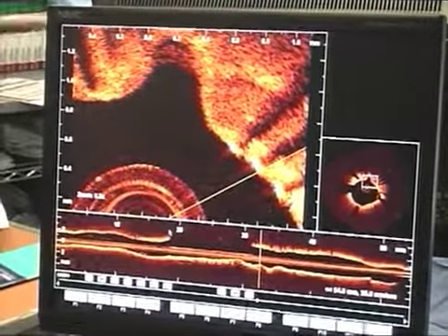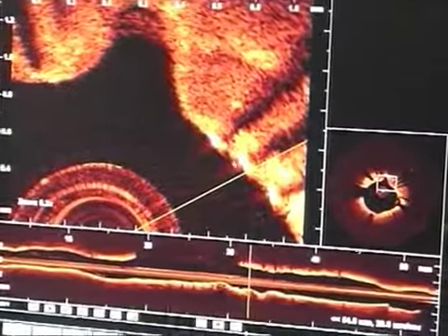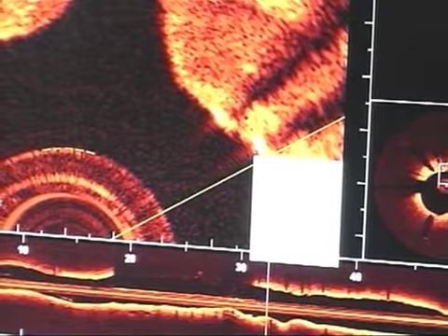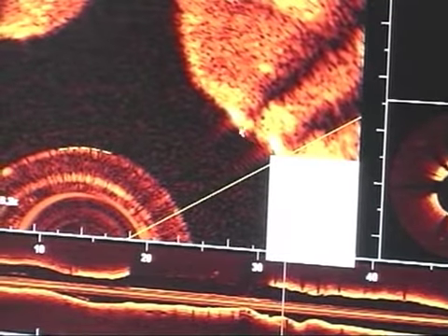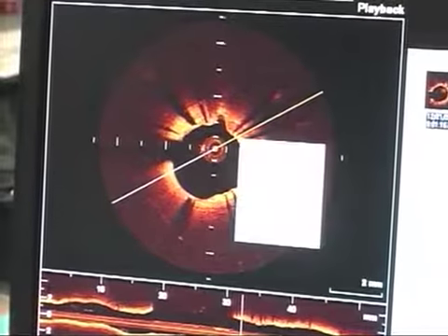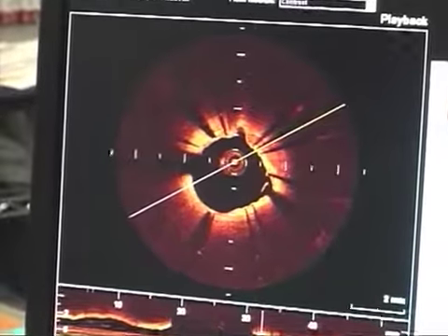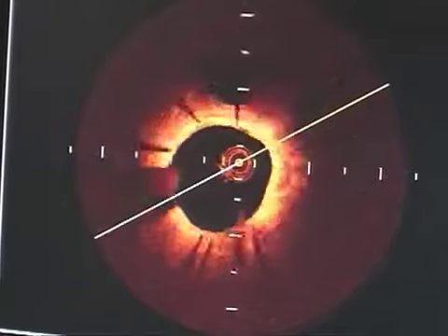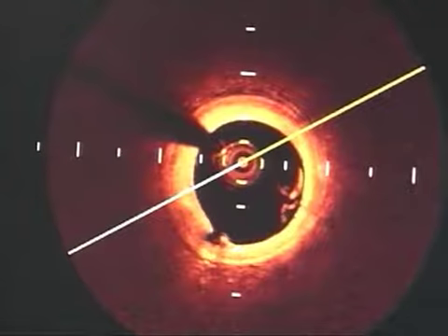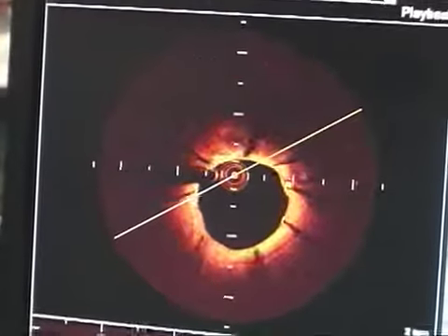You can see that it looks like there's not a lot. You have a layer, probably a layer of cells, on the top layer of the upper and the middle as well. So with the resolution of 10 microns, if you see a layer, you know there is at least a cell or 2 cells on top of that strut, and it may give you some reassurance in this specific evaluation for this strut. As I said, you have to be careful and evaluate the whole stent, in this careful decision making for dual antiplatelet therapy.